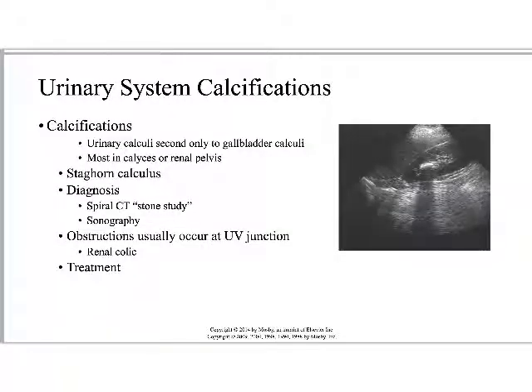Okay, I did want to at least throw one ultrasound image in here, and expect to see some ultrasound images as we're looking at this stuff. This is probably the easiest one for me to look at, because it's one of the few ultrasound studies I can look at and say, yeah, there's something going on there. Everything else I see on ultrasound is like, what, is there a storm coming in over the interstate this afternoon? I don't know what I'm looking at here.